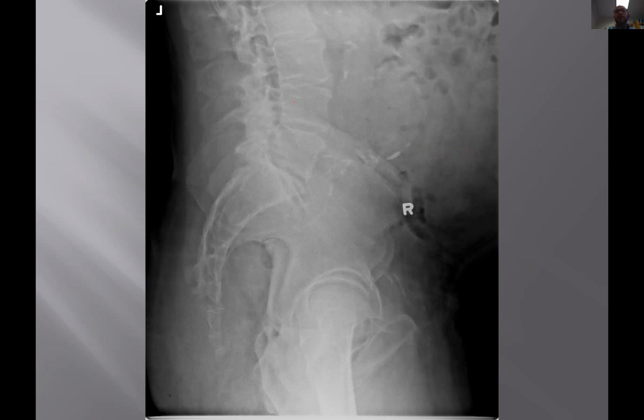Now, there is a little grade 1 degenerative spondy from facet arthrosis. There's degenerative change here. There's some funky developmental changes at the back of the sacrum. All that's no big deal. That's why you're not talking about it. But let's see if you can get 2 other possibilities.